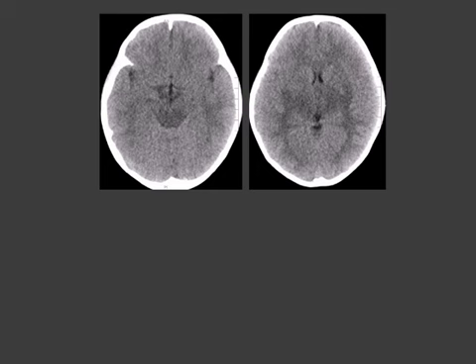This was a very unfortunate patient. This was a child 4 years of age. You will definitely not want to miss something like this. This initial CT scan was read normal. This was in the middle of the night.